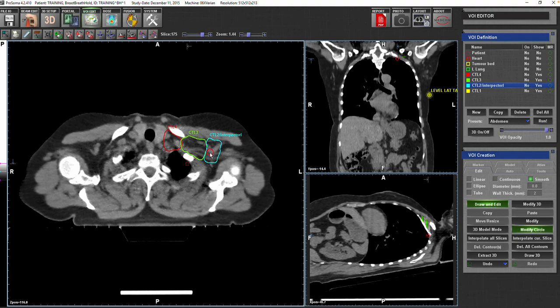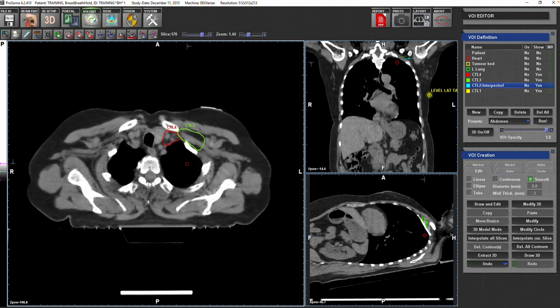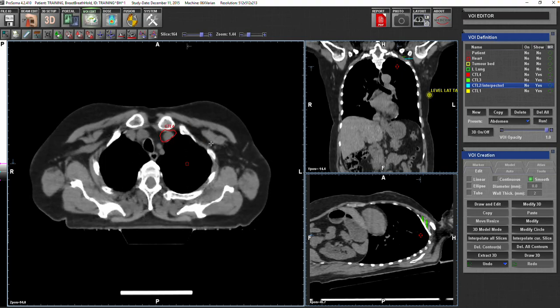You have one of two options, which I usually do, is just join the posterior wall of the chest wall, so just at the level of the chest wall. So take a margin from the vessels as well, in terms of posterior and ventral. And then this will be the start point of level 2. What should we do? We'll do the same as we did in the last one. I will go down, but where I will go down, I will follow my pectoralis minor muscle along its insertion.